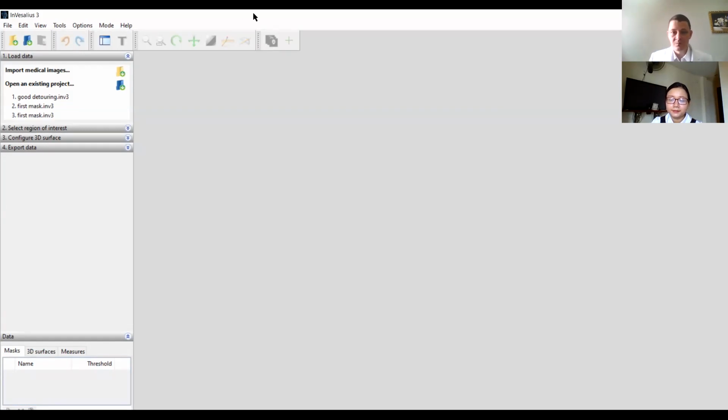Thì file thứ nhất là file mà hàm trên và hàm dưới không chạm nhau, cho nên phần mềm có thể dễ dàng tách hai hàm ra. Còn file còn lại thì hai hàm trên hàm dưới chạm nhau, cho nên rất khó để tách ra. I will begin with the easy one, and after I will show you how to do the hard one. Bác Nicola sẽ bắt đầu với file dễ trước, và sau đó sẽ làm file khó.